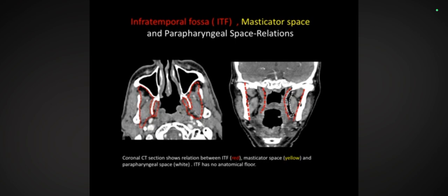My take on this is that disease is not black and white. It does not end there only. When I see temporalis muscle which is bulky, it doesn't end where my eyes see it. It has a margin up and down. So if the coronoid process is involved, I'm coming to the next section. This is on the coronal section, showing how it is in the boundary.